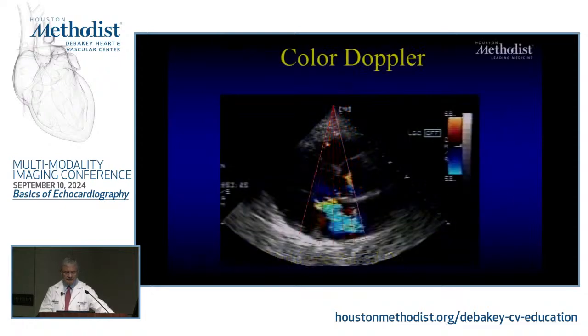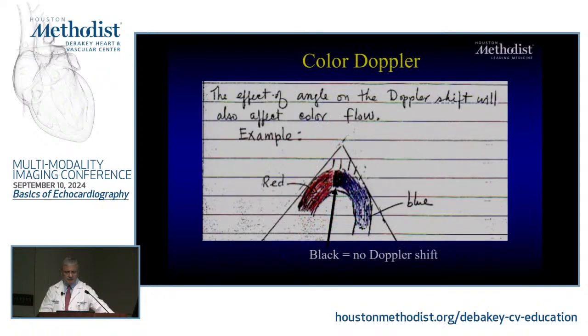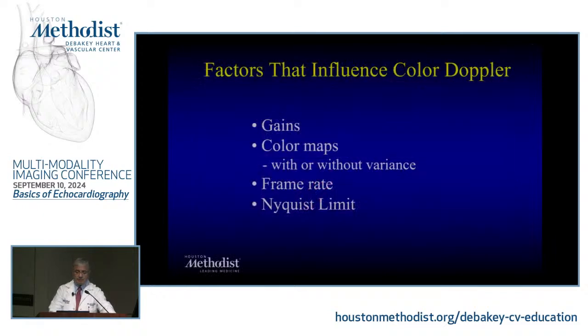And it's in a way multi-gate, and that's why you detect basically regurgitation direction and everything else. Can't quantitate as well because you can easily have wrapping around, higher aliasing possibilities. Remember, we talked about also that in the arch, if you're perpendicular, you're going to have a black band in between the reddish versus the bluish colors.